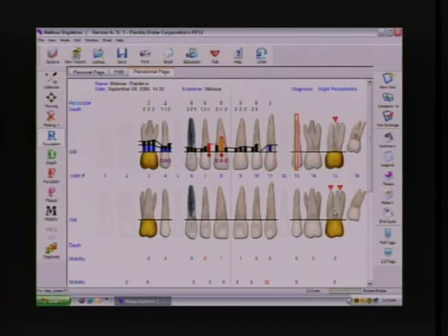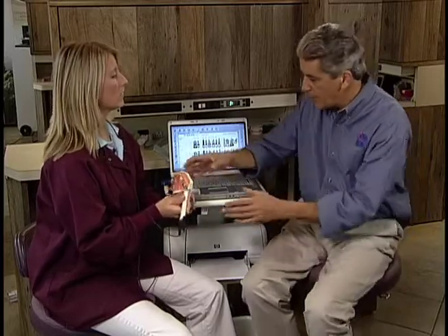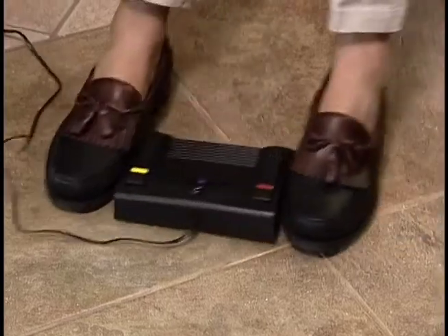Three. You're doing great with recession. Let's spend a minute and talk about the ergonomics of the foot pedal. Okay? Let's go ahead and set the model down because we're not going to need it. And I haven't seen you work yet around the chair. And I don't know how much you move around the chair as you move. But it's important that you take the foot pedal with you as you move around the chair.